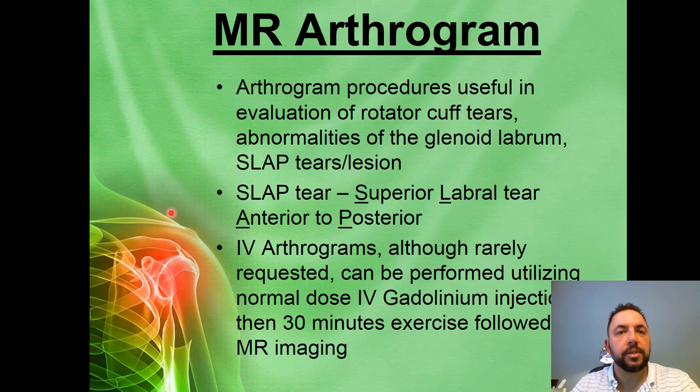Intra-articular arthrogram, although it's a little more invasive for the patient, is useful in the evaluation of rotator cuff tears or slap tears or lesions. Slap tear stands for superior labral tear, anterior to posterior.